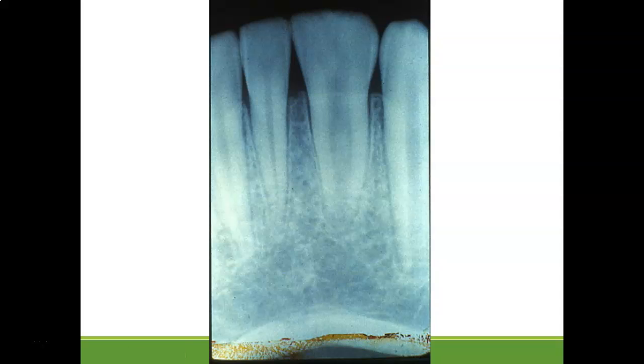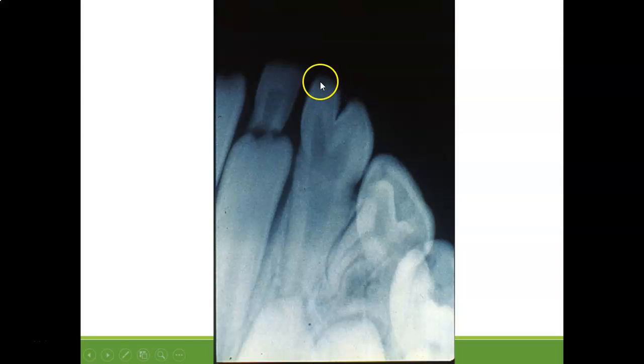So here's an example of fusion, because we have 1, 2, I think this is a canine. So we have 1, 2, 3 incisors on the mandible, but this one's really big. So this is fusion. And then here, if we were counting and we weren't really paying close attention, we might count this as 2 teeth. So we might think there's more teeth there, but you can see how this tooth was trying to divide into 2 and it gave up and just stayed 1. So this is gemination.